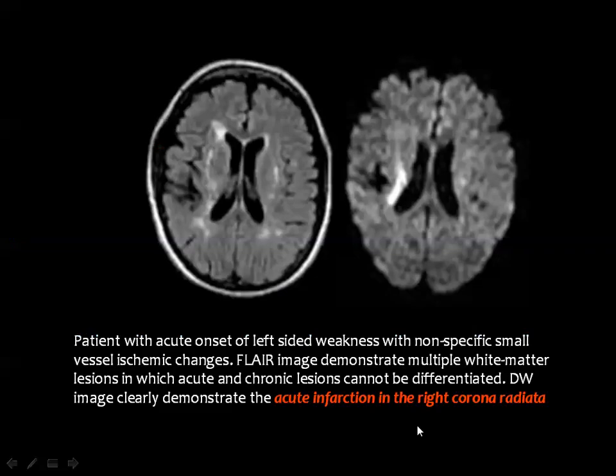Then in diffusion weighted images, this is the FLAIR image, and you see bright foci bilaterally in the white matter. And in the diffusion weighted images, all the chronic lesions will not appear, but the acute one will be shown here. This is the site of the lesion.